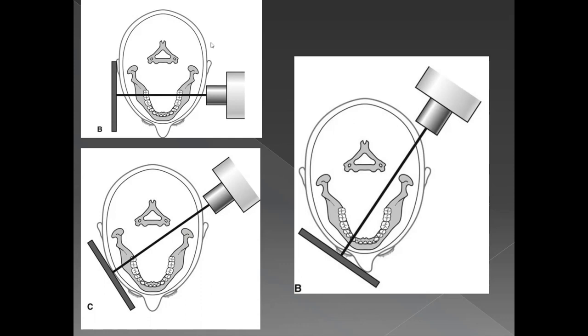Obviously you cannot take the cervical spine out of the patient so you can view the anterior mandible clearly. This is the reason why in some books you will come across the recommendation that whenever you're evaluating the anterior mandible, you should either do a periapical of that area or an occlusal X-ray. That can show you some additional information that may have been masked by the cervical spine. I hope that portion is clear and that we can move on.